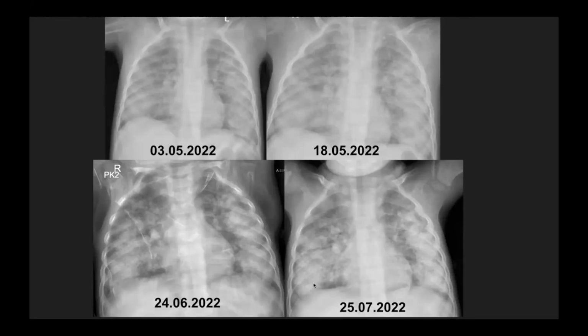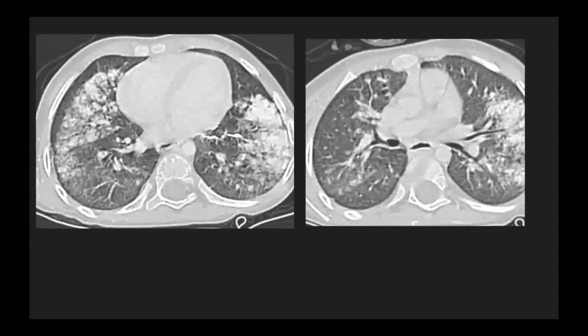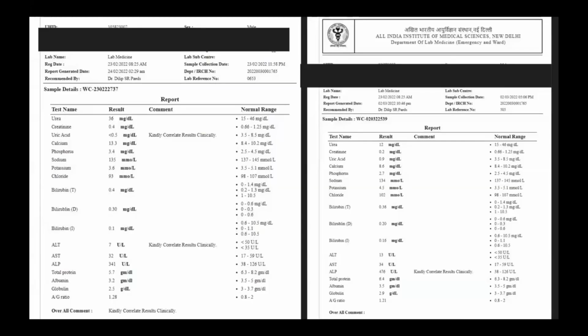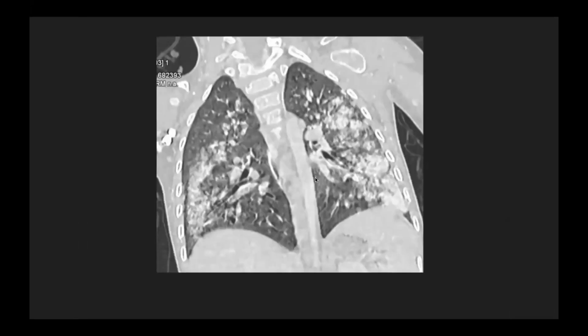Once we did CT, we could see a very peculiar finding of confluent pulmonary airspace opacities, which looked very, very dense, like calcification, because this was a CT. So outrightly calling it calcification was not possible. However, when we measured the HU value, it definitely showed that this is calcification. So there is diffuse calcification within the pulmonary parenchyma in a typical pattern where exactly the pneumonic affection was. So where exactly the Pneumocystis pneumonia was, in the same location, now we are getting parenchymal calcification.